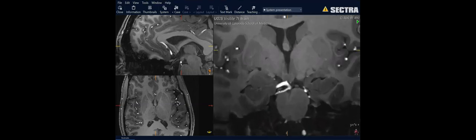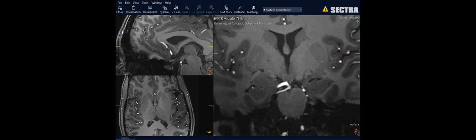Now, between those two blood vessels, this signal intensity in here is the oculomotor nerve. So the oculomotor nerve, the third cranial nerve, can be found between the posterior cerebral and the superior cerebellar. And it can potentially be impaired by aneurysms at that terminal basilar artery. And so again, looking closely: inferior horn, lateral ventricle, hippocampus, amygdala, putamen, and globus pallidus, internal capsule, body of caudate.